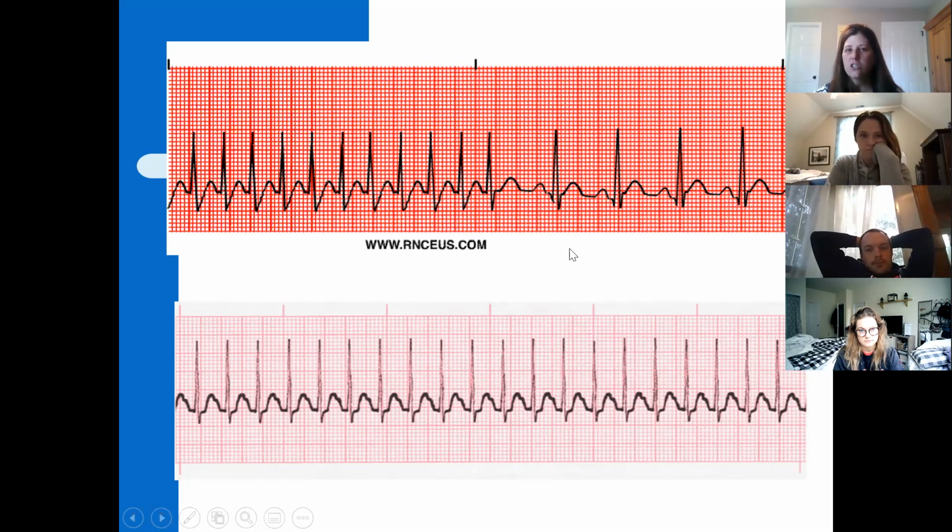It still doesn't change the fact that there's always going to be 5 little squares vertically and horizontally inside each bigger box. That's not going to change. Ms. Teven, so for the bottom one, when we got 200, when we were counting, would we always use the 6-second one? I think we multiply it by 10?